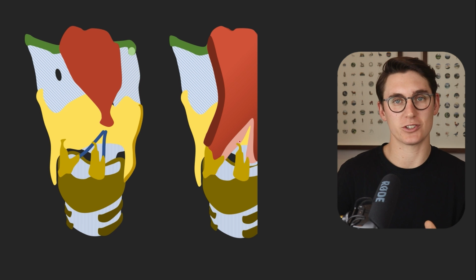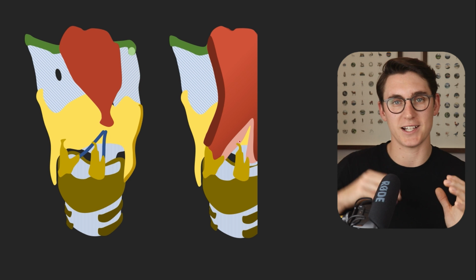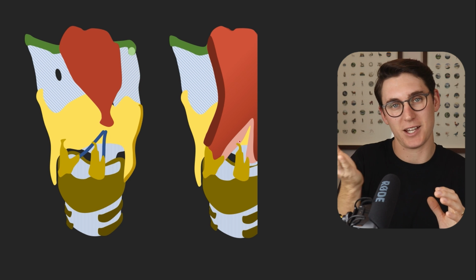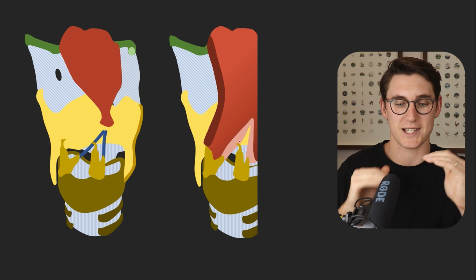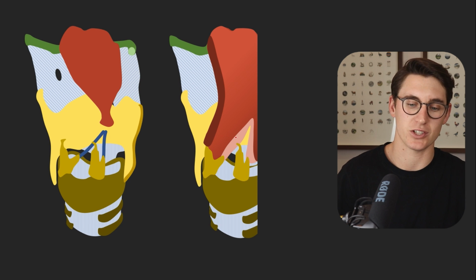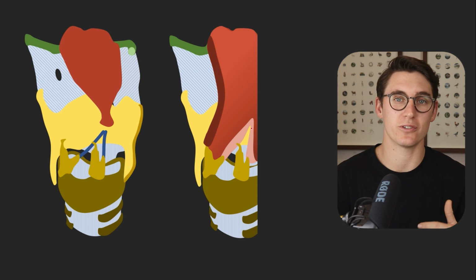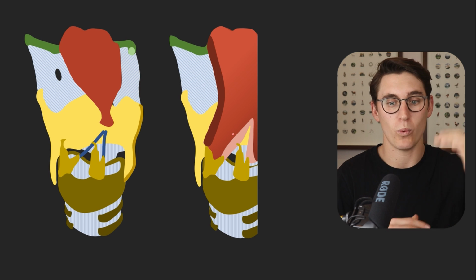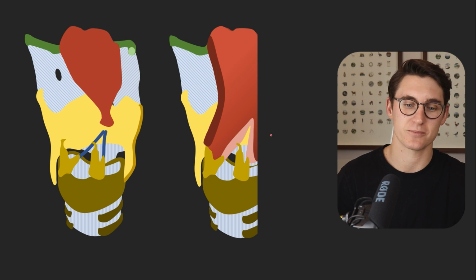Now, it might be quite difficult to see on this diagram, but I want you to realize that that false vocal cord comes in, makes a laryngeal ventricle, and then comes out to make our true vocal cords. There's actually a space between these two pieces of tissue. When we look especially at our coronal images, we're going to see that laryngeal ventricle. It's a really important landmark when staging laryngeal cancers.